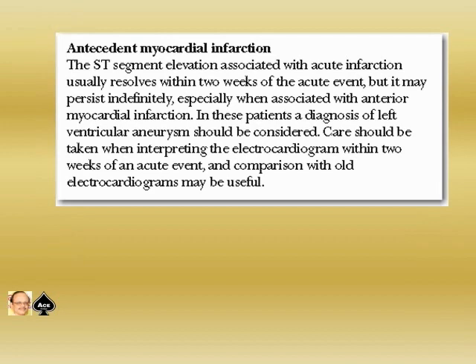Antecedent myocardial infarction. The ST segment elevation associated with acute infarction usually resolves within 2 weeks of the acute event, but it may persist indefinitely, especially when associated with an anterior myocardial infarction. In these patients, a diagnosis of left ventricular aneurysm should be considered. Care should be taken when interpreting the ECG within 2 weeks of an acute event, and a comparison with the old ECG may be useful.